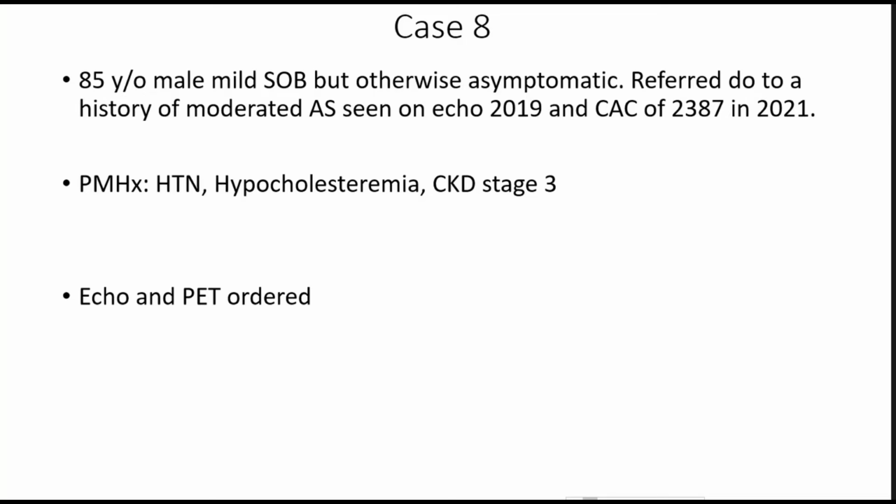I mean, to me the key is when we go back and we looked at that 2018 echo, you could clearly see that there was echo-free space around that valve post-procedure. I think that kind of made things difficult, if not impossible, unless you saw an actual vegetation, to define whether or not you were going to deal with infection down the road. Yeah, I would agree with that.